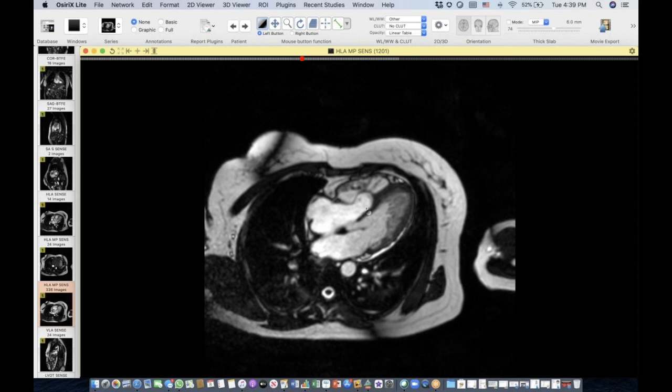So basically, this is the medial part of the tricuspid valve leaflet that has been completely displaced anteriorly or apically towards mid-ventricle. So that's Ebstein's anomaly. So that's where there's malposition of that valve. There's not a lot of tricuspid insufficiency in this case, and we don't see that huge right atrium.